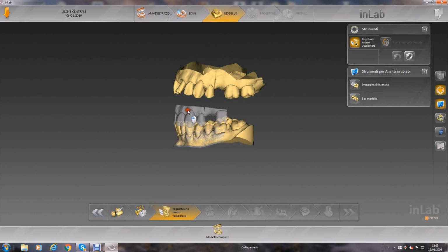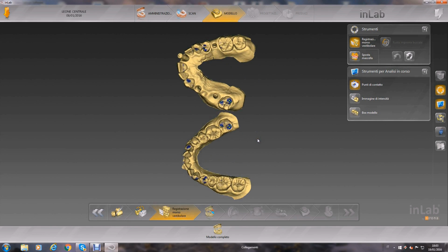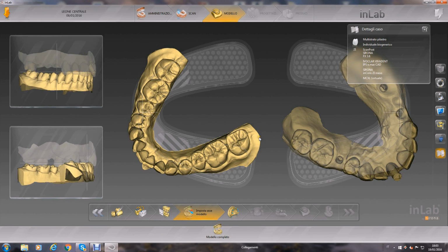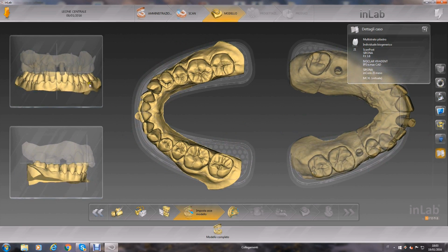Here we are checking the buccal bite registration in order to examine the relationships, proportions, and the contact points. We align the two jaw models within the schematic arches and align the horizontal and vertical guiding lines in order to help the software determine the planning of the teeth.